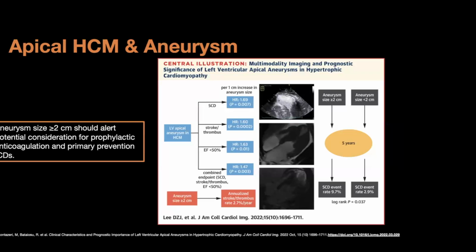The thing is, remember the apex is actually thinner than the rest of the ventricles, so the criteria for HCM 13, 15. Yeah, there are times on echo we'll describe the lack of tapering at the apex as maybe an early sign of apical HCM. So I feel a bit sensitive.